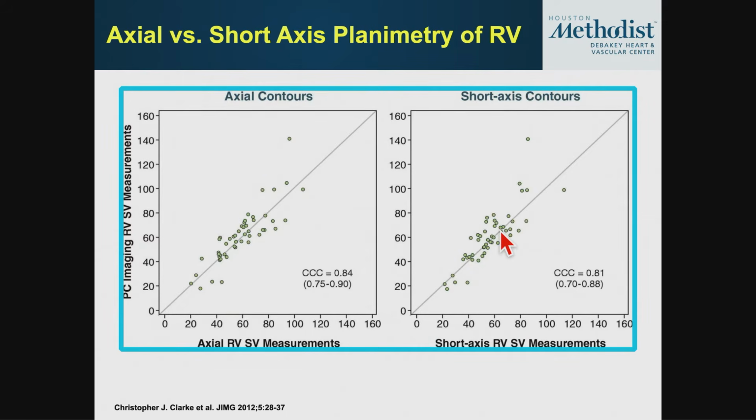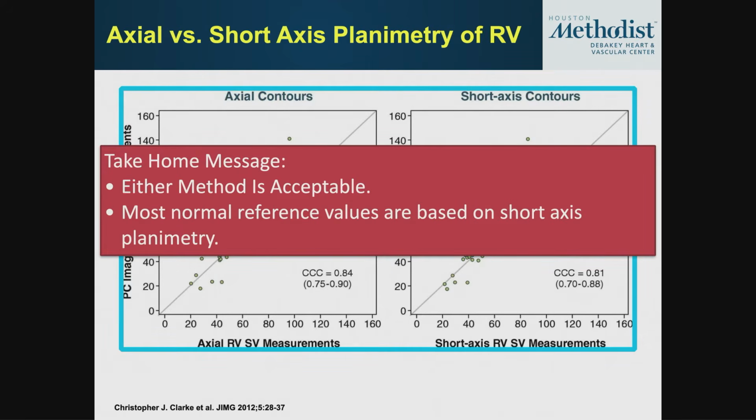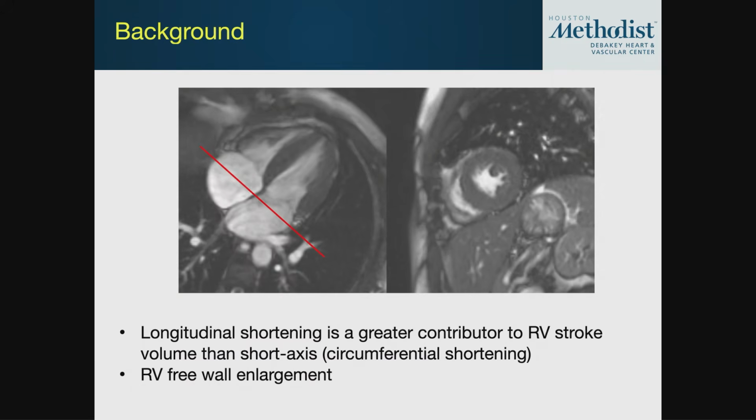And so really from a practical standpoint, we'll rarely do the long axis stack of the right ventricle because again, that requires a whole bunch of extra breath holds and a bunch of extra views. Now there's one caveat to that. There's one exception where you will specifically want to do that.